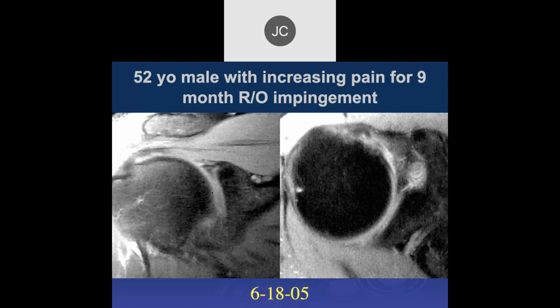This guy is 52 years old, and the lesion that you see there looks very innocuous. Doesn't look like there's anything substantial. But if you look at the supraspinatus tendon, that's where your pathology is. This isn't quite windowed to see the supraspinatus very well. Maybe you're right. It looks like it's frayed in that area, and maybe a partial tear. But that looks worse than the labral area.